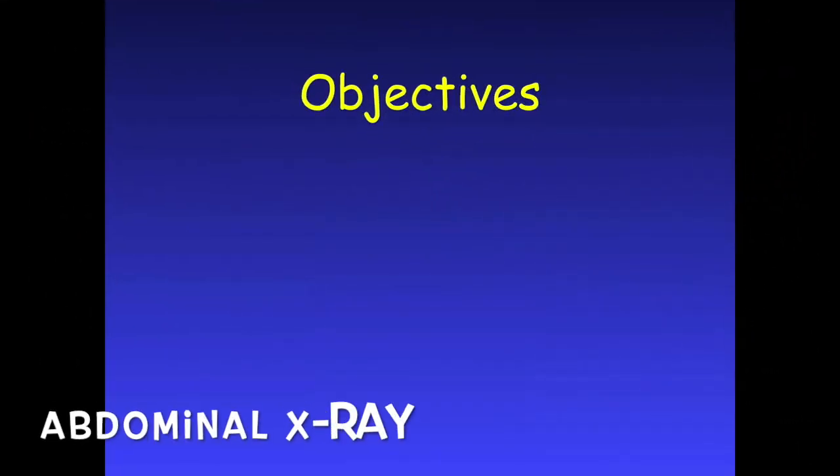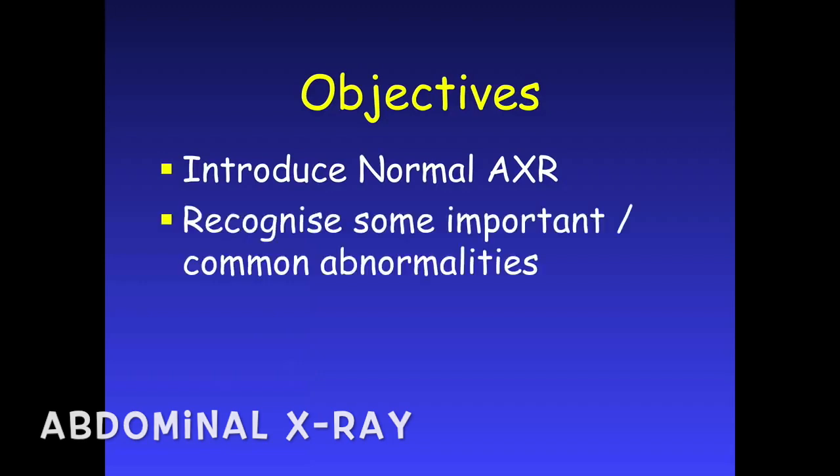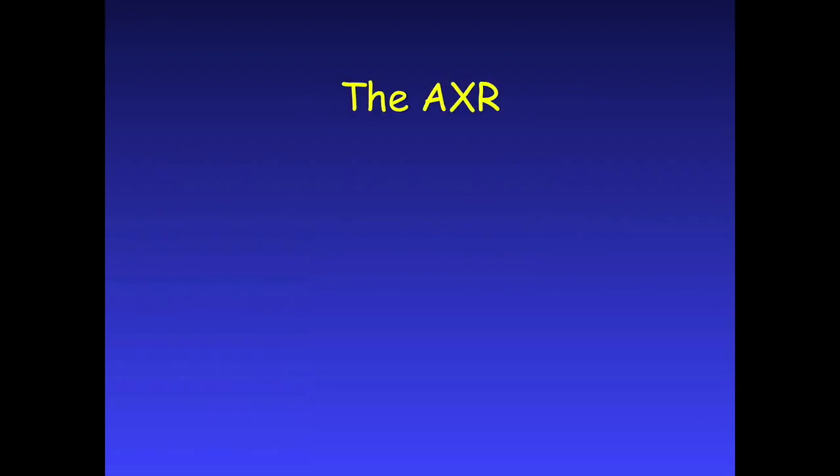Approach to an abdominal X-ray. Our objective will be to introduce you to a normal abdominal X-ray, a couple of normal X-rays, and then recognize some important or common abnormalities.